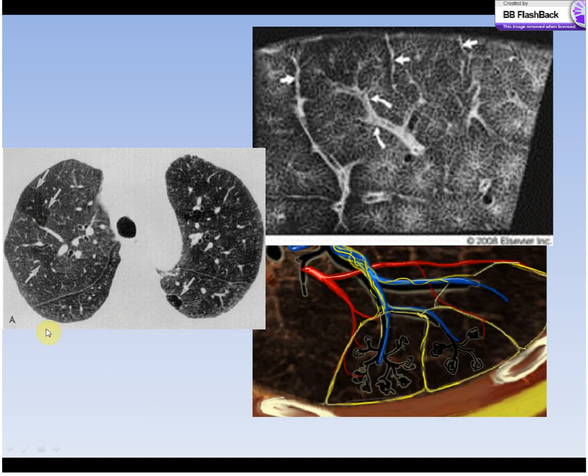And this is what a CT chest looks like here. The arrows are pointing to an area that would include a secondary lobule. That would be many secondary lobules in that area, in fact. This is a zoomed blow-up portion of that. And here you see the terminal bronchiole going into the alveoli, and the thin septae around the outside there.